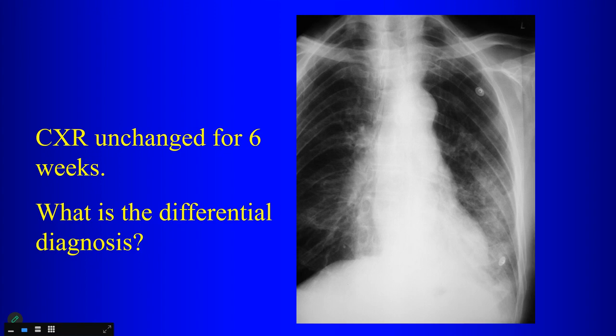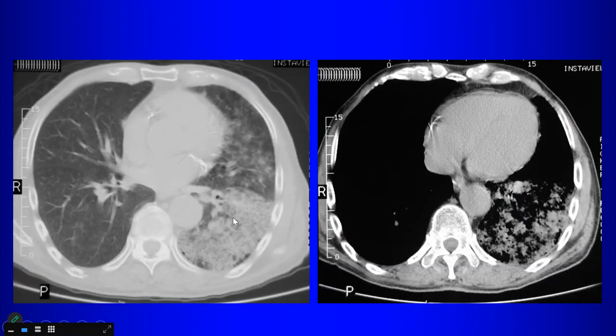You mentioned peripheral consolidations. We can also see that with organizing pneumonia, of course. Fungal infections can also be associated with chronic consolidations. This particular patient, just a nondescript chronic consolidation in the lung, did turn out to be adenocarcinoma. There is another infiltrative neoplasm, of course rarer than lung cancer, that can also present as chronic airspace disease in the lungs. What neoplasm is that?